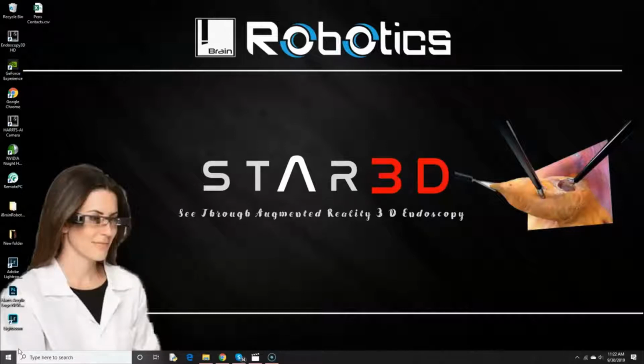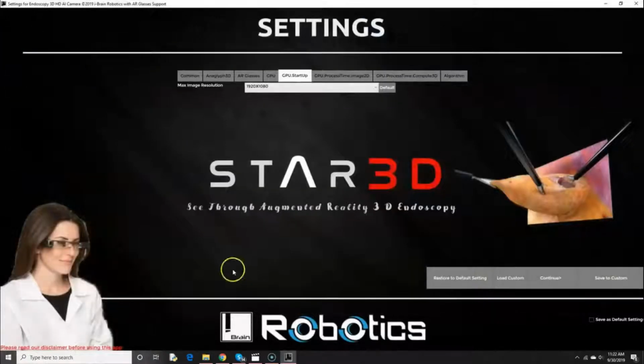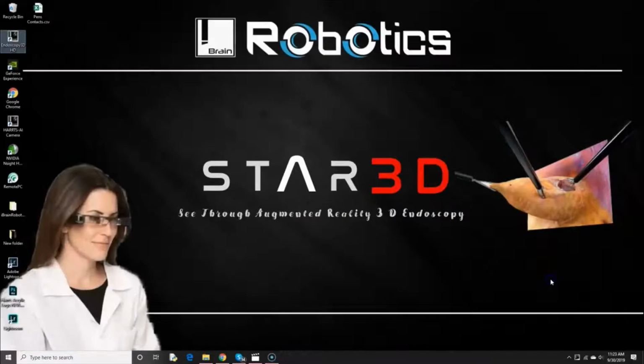Once you've turned on the console, you will be able to locate the app called Endoscopy 3D. Right-click to open. This will bring you to the main settings page. The app comes with default settings that we suggest you use. From this screen, you just need to hit continue.